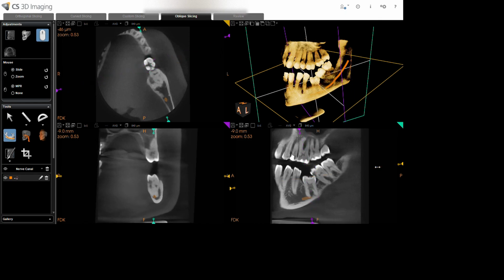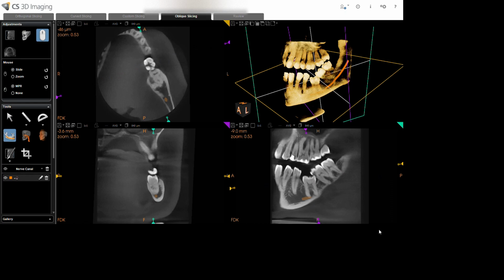Here, the first thing which comes to my mind when I see this is that tooth 36 is submerged. As you can see, the occlusal plane is nearly at the level of the CEJ of the adjacent teeth. This tooth is causing cervical caries since it is in close contact with, or abuts, the mesial cemento-enamel junction of the adjacent tooth. That is of concern, because if you don't go for any treatment option, then along with tooth 36, tooth 37 will also undergo more and more damage.